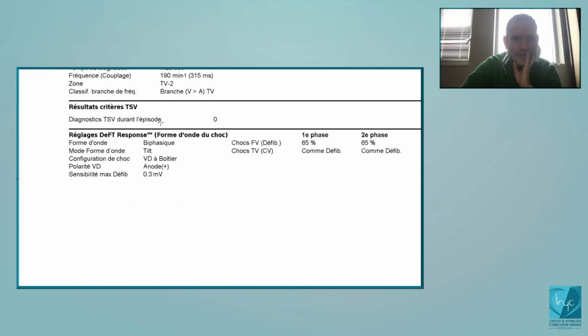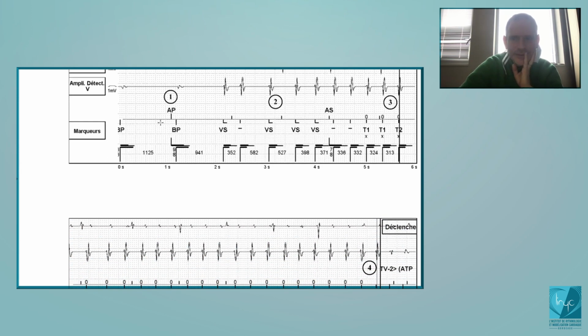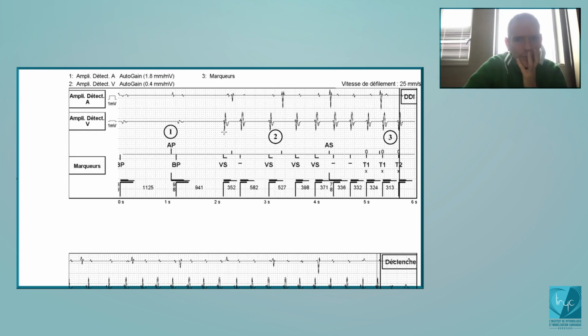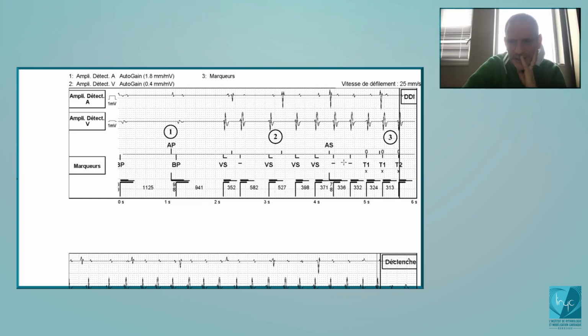So now, what do you think here? This is a CRT device. Then what happens? There's a PVC maybe. Yes, probably, and an arrhythmia, okay? So all the time, the very first cycle is non-classified or classified in transition, because this interval is short, but the average value is slow.